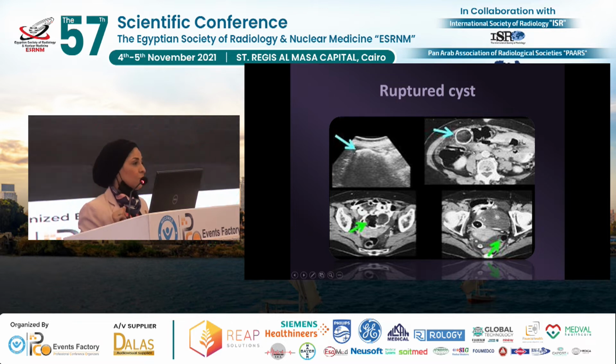This is not an emergency. Lots of people might find during a CT scan the eggshell calcification surrounding a fat lobule, which represents an old episode of ruptured dermoid cyst, but this is not in the acute setting. This is usually coming incidentally for another setting to do a CT, okay?